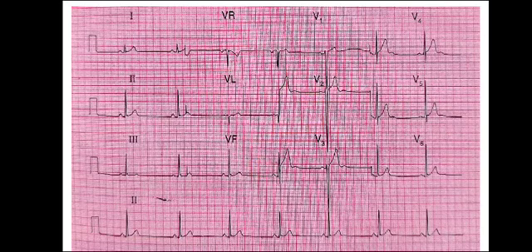And the modified Cornell criteria is we have to examine the R wave in AVL, and if this R wave in AVL is greater than 12 mm in an ECG, this will be termed as left ventricular hypertrophy. So we have learned the Sokolow-Lyon criteria, the modified Cornell criteria, and the simple Cornell criteria. But there is a newest criteria that is used nowadays that is known as Peguero-Lo Presti criterion.